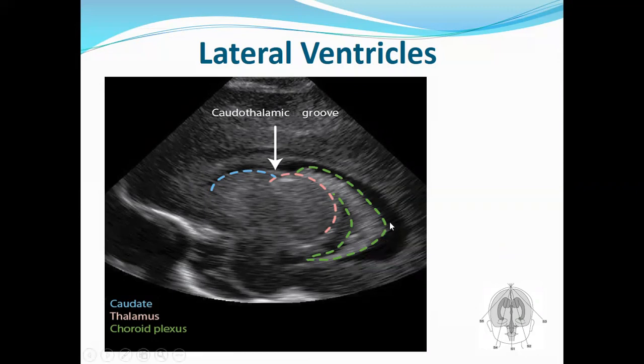So these images, if you have seen, I said 5 coronal, 5 sagittal. So 5 sagittal, there are 5. Don't be confused. So this is 1 at 90 degrees, 2 lateral either to the left or to the right. So you count 2, 3, 4. This is number 5. So these you have done.